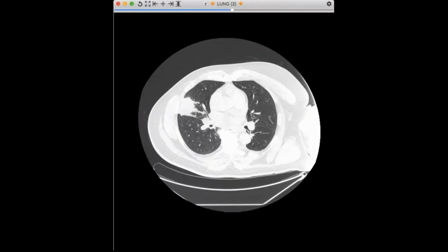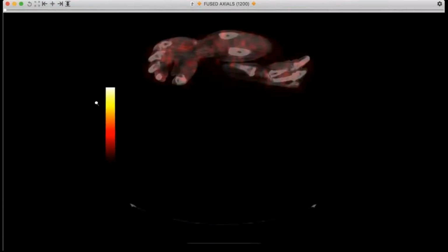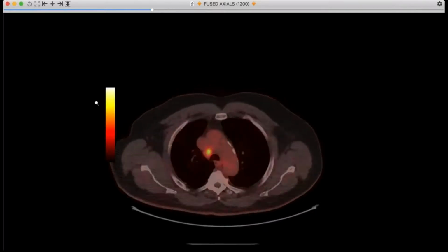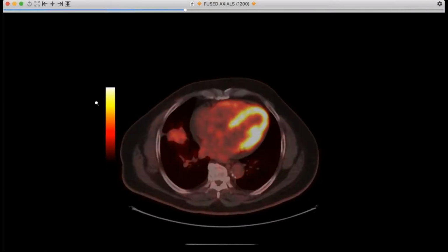And so I was presented with the case by the consultant after the PET CT was done. You can see there's the mass, and there's uptake in the nodes. So it's a limited stage small cell at this point, but there is nodal involvement. And for a small cell, it moved pretty slowly, considering it presented back in October.